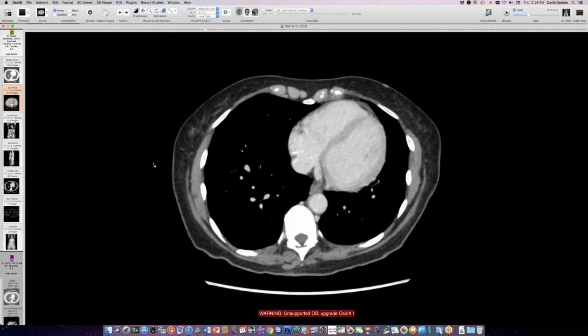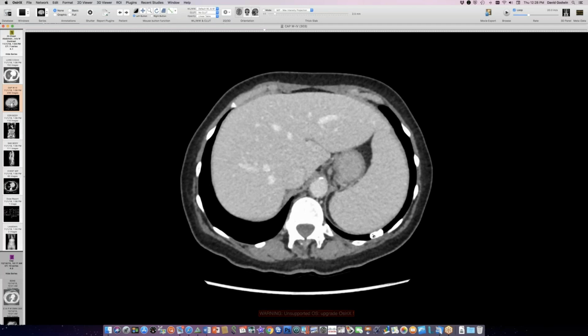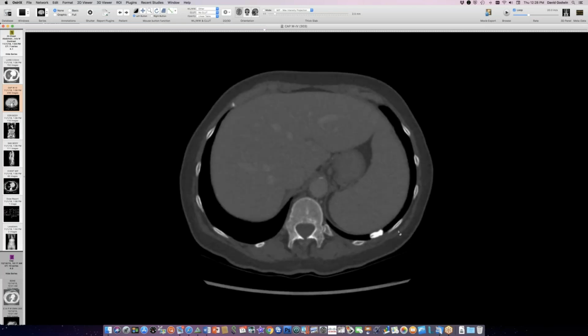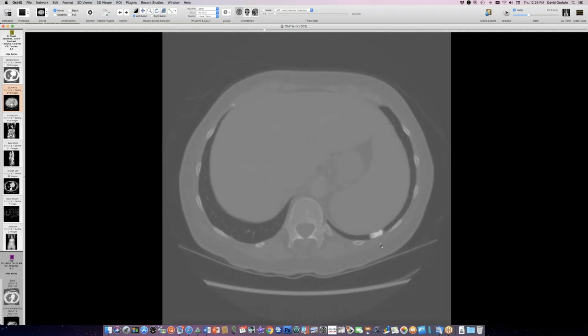Now on this later CT, a few years later, you can see that it's shifted locations down here, and it's fatter than the ribs, but it again looks rib-like in terms of having cortex and medulla. So it looks like a piece of bone to me. But there's no rib fracture, and all I can do is call this a thoracolith.